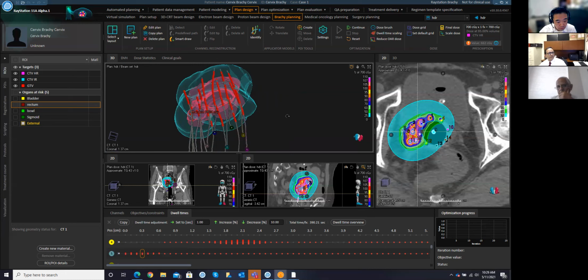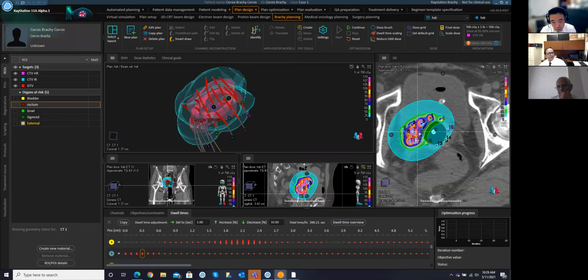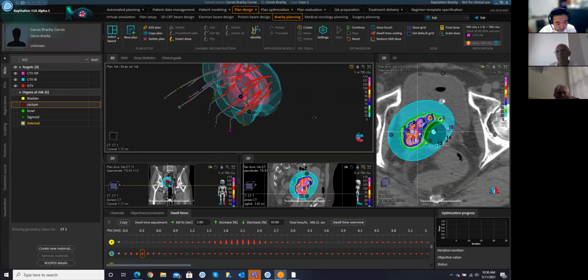Yeah, I would think yes. If you're doing an endobronchial, the automatic channel detection is going to start at the nasal end, but you have the option to flip it, and then you'd flip it. That'd be part of your workflow.